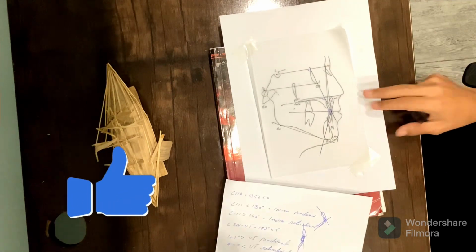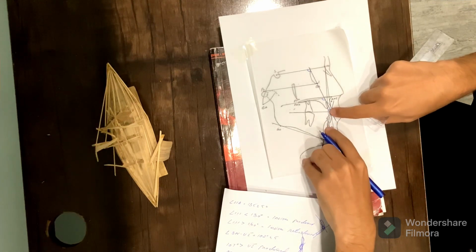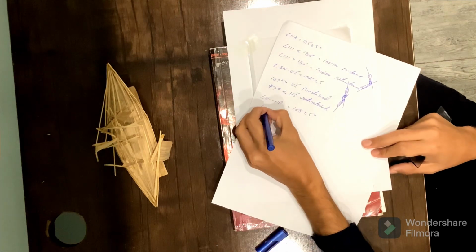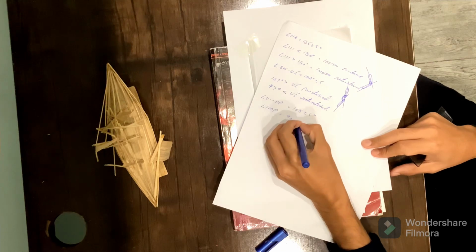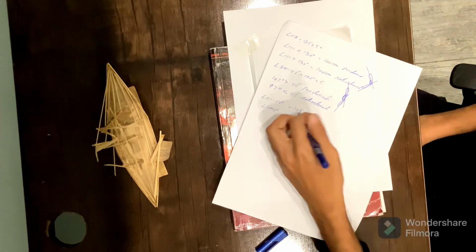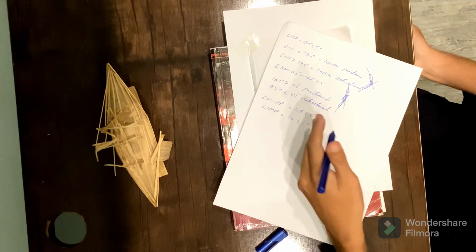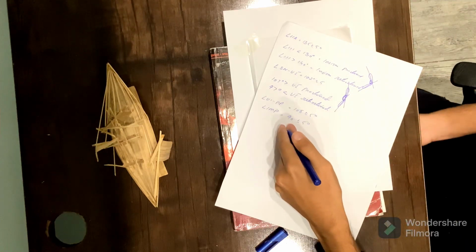Now the lower incisor line passes from the incisor tip to the root tip. This angle intersecting the mandibular plane, the incisor mandibular plane angle, should be equal to 90 degrees plus minus 5 degrees. So this angle is very important. It tells us the relationship of the lower incisor with relation to the mandible. If it is greater than 95 degrees, the incisors are proclined, and if it is less than 85 degrees, the incisors are retroclined.